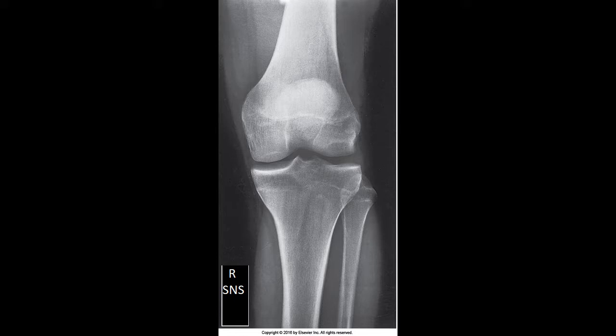The patella is superimposed on the femur, and there is an open femorotibial joint space. And the interspaces are equal on either side, and you can see the soft tissue and the trabecular detail of her bones. So all in all, this is a good image. You can see my marker on there, and that covers the AP projection of the knee.